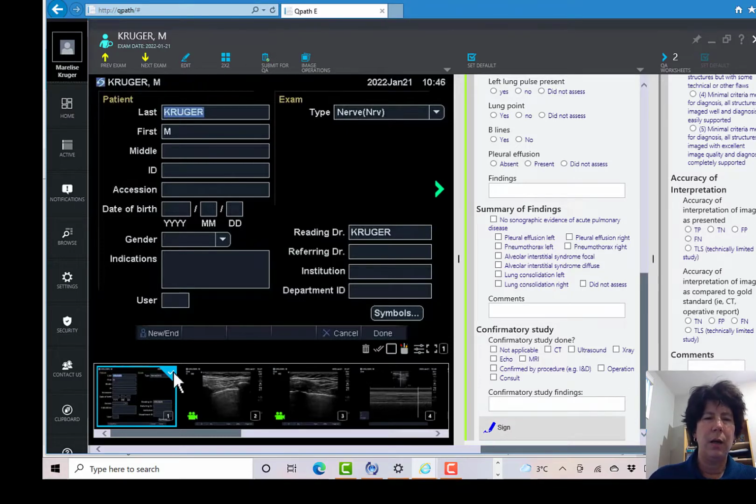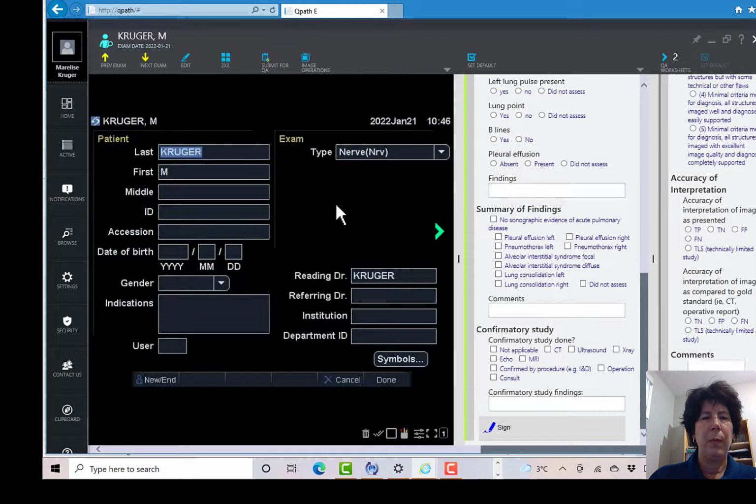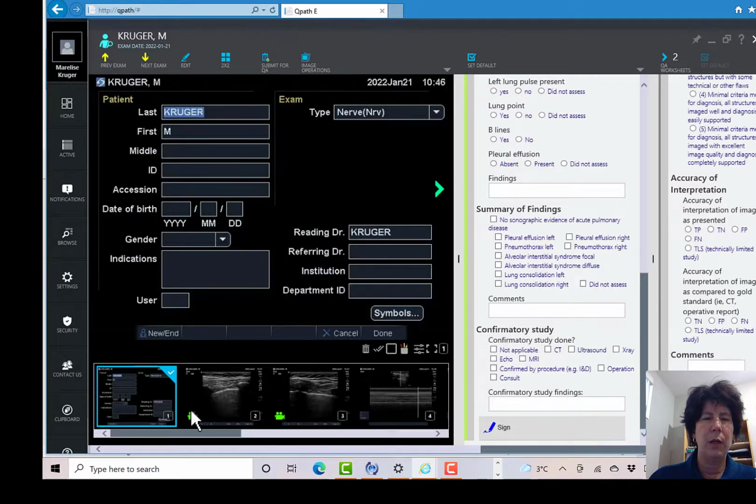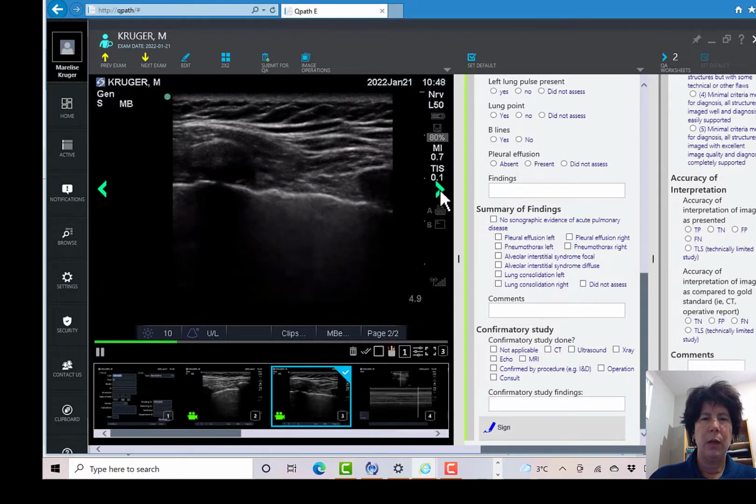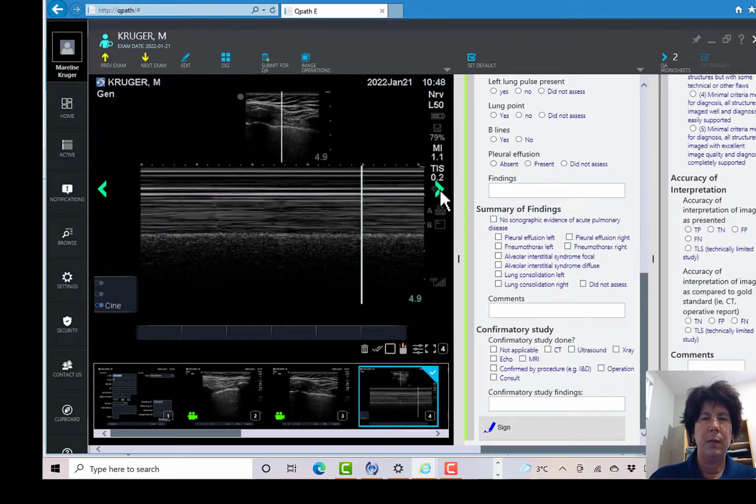You can advance your study. So this will be your home screen. You advance your study by pressing on the arrows. So you can zoom in and out of that little thumbnail area just by clicking or clicking again. And then using these arrows to move between the boxes.